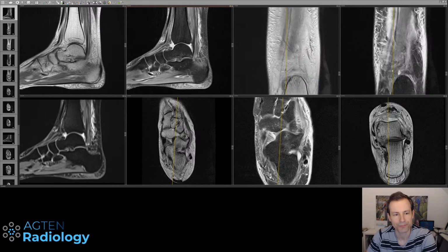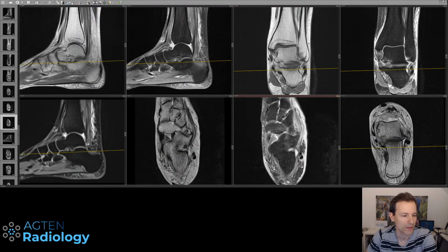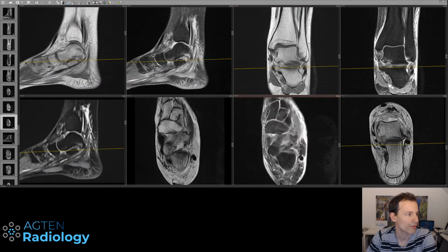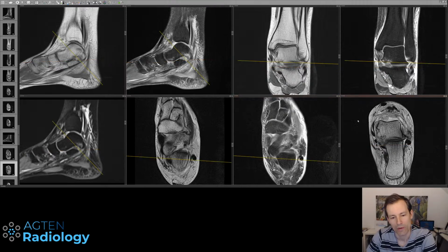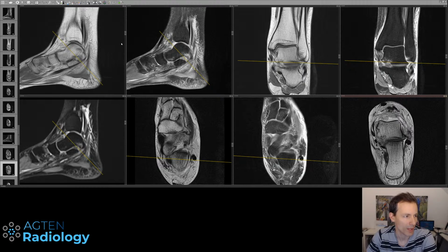As you can see, it's quite an extensive protocol here from that institution, and I have all the labels off, so as not to fall into some kind of issue with patient data, although it's all anonymized, etc. Anyways, but I think the year of birth is given on this program even after anonymization, so I'm just going to prevent this.